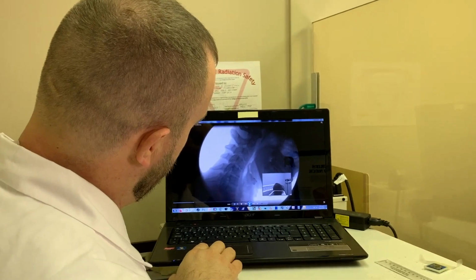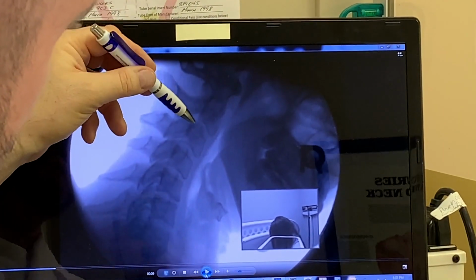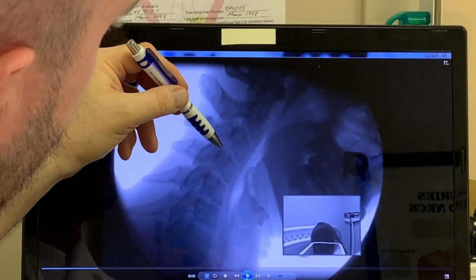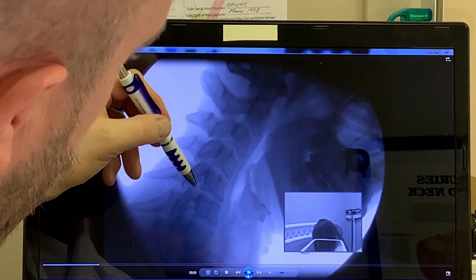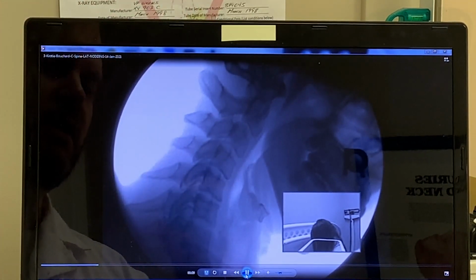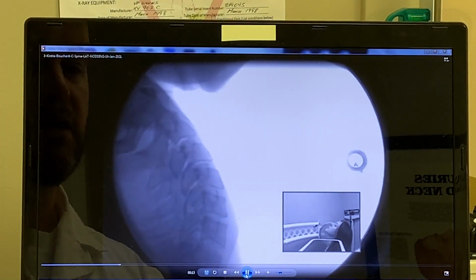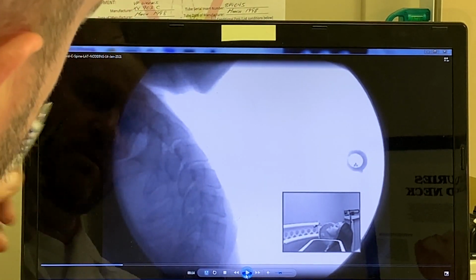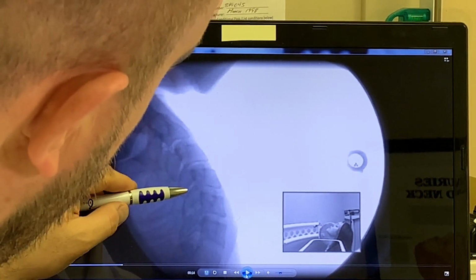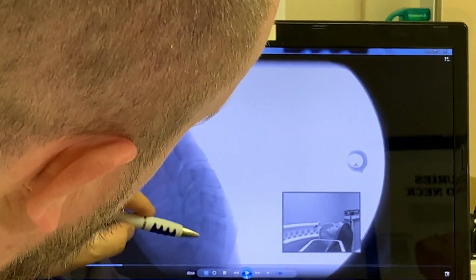So as you go forward here, then this being your second neck bone, the black line there is not aligned with this black line anymore, and then these two are subtly not aligned, and then these ones are aligned, these ones are aligned, and these ones are aligned in this position. And then when you go back, we're looking for the same thing. So if I freeze it roughly there, again, these two lines here do not line up, these two lines do not line up, these two lines do not line up, these ones do, and these ones do. Can you see that?